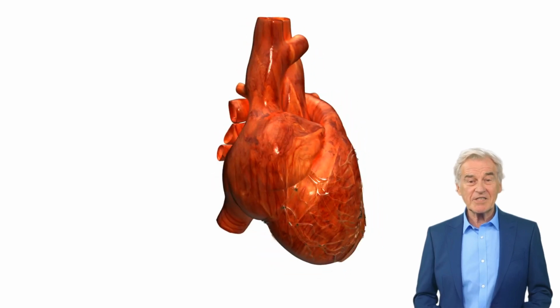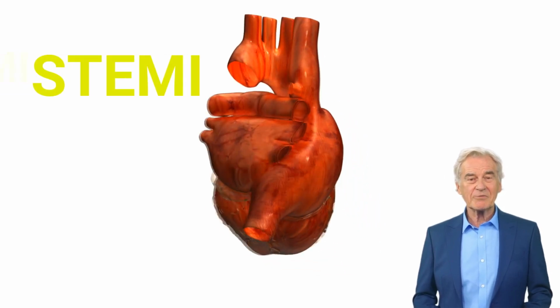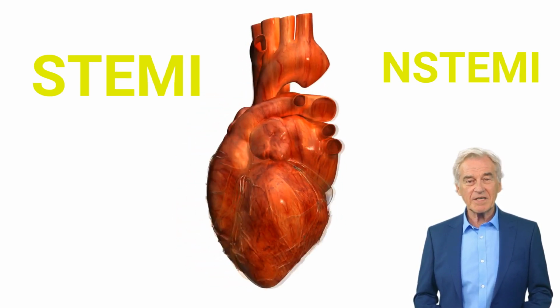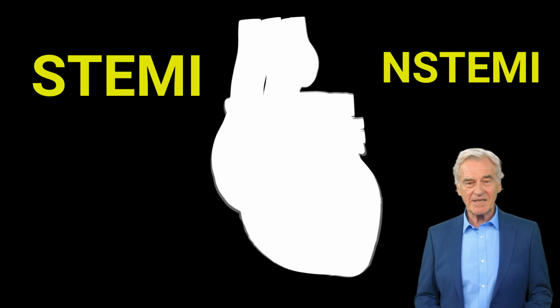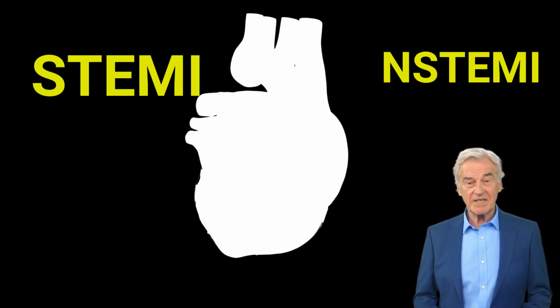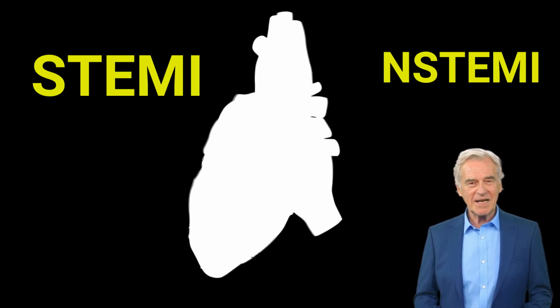Welcome to our presentation on ECG variations in STEMI and non-STEMI myocardial infarction. In this session, we will explore the distinct electrocardiogram patterns associated with these two heart attack types, their importance, and the significance of ECG in their diagnosis and management.